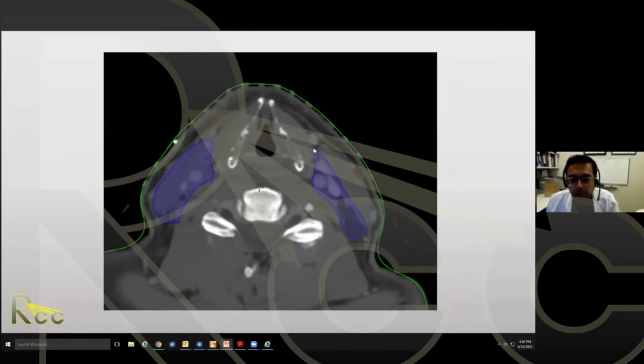While I would keep on the left undissected neck, I'm treating electively, focused on the borders we've discussed. In the right neck, I'm going to cover the entire SCM, and you've seen I've placed a wire on the neck dissection scar. And also, everyone has different amounts of subcutaneous fat.